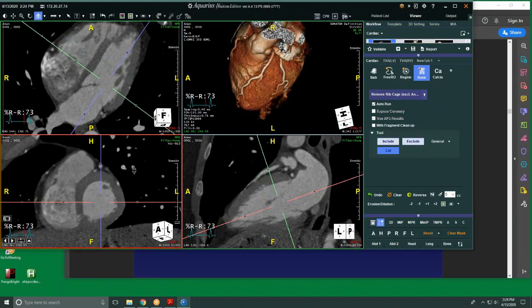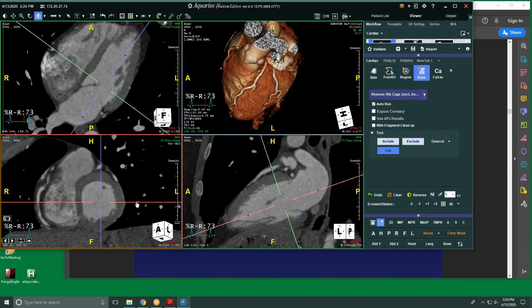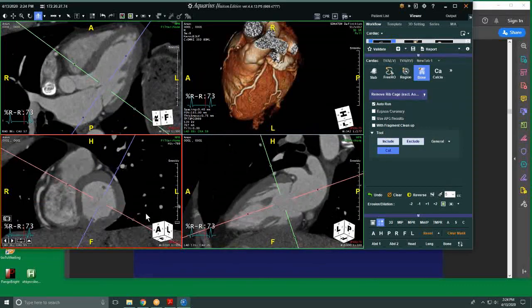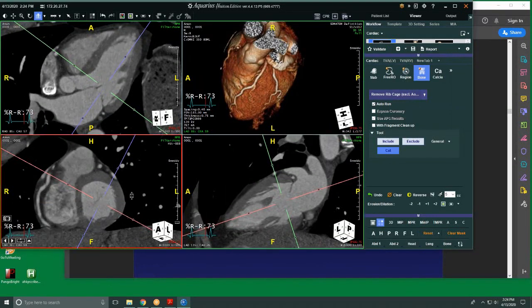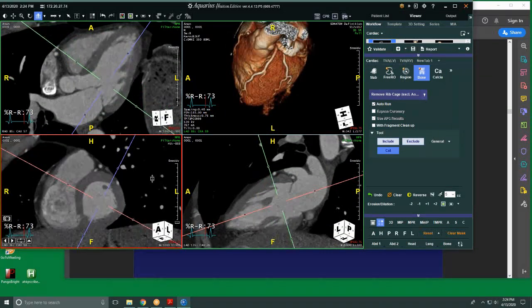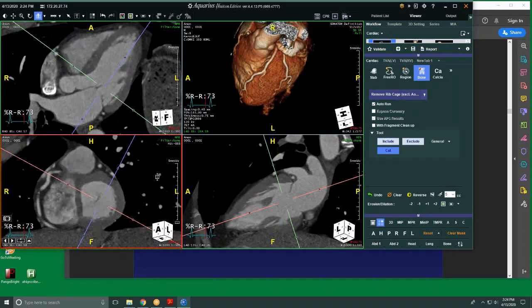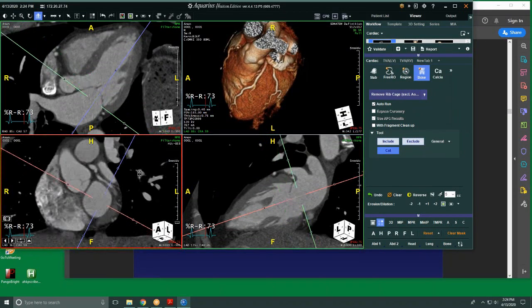Those are the, anyone know? Papillary muscles. Okay? Papillary muscles. There you go. Trying to show it to you guys a little bit better here. Yeah, you can't see the chordae tendineae, but you can see your papillary muscles there very well. They support the mitral valve apparatus and basically keep the mitral valve from prolapsing back into the left atrium. And so these are the papillary muscles.